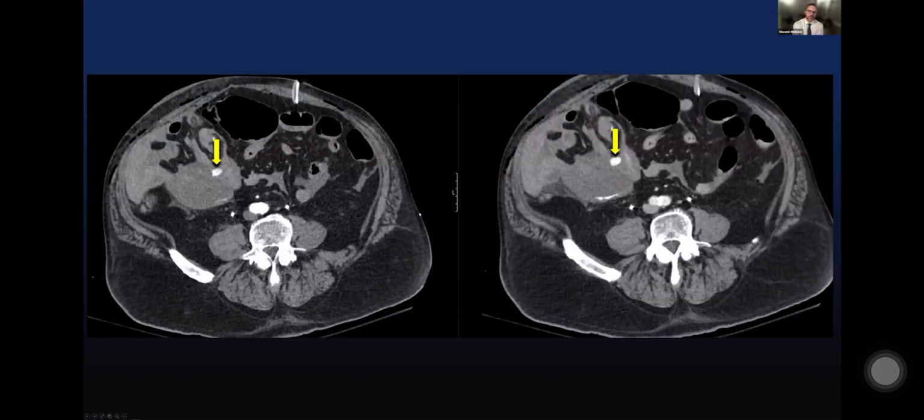A lot of people spend time differentiating between active extravasation and pseudoaneurysms in someone who's bleeding. To me, especially when it's in the mesentery, it really doesn't matter. Both of them mean that there's a hole within the small bowel artery. In this case, there's a pseudoaneurysm, but also active bleeding here. You can see the active bleeding is spreading out, whereas the pseudoaneurysm doesn't.